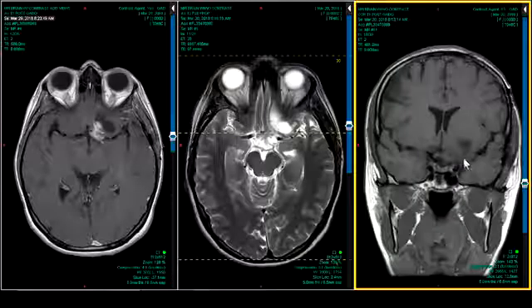Now, I think this one is probably arising from the optic pathway. Right. It's wrapped really around the chiasm, right? It might have come from the chiasm. Yeah. Because there's a lot of solid tissue in the left portion of the chiasm, that's directly right. And so these optic gliomas that we showed, those are pilocytics, right? And this is a pilocytic. Mm-hmm. So kind of related.